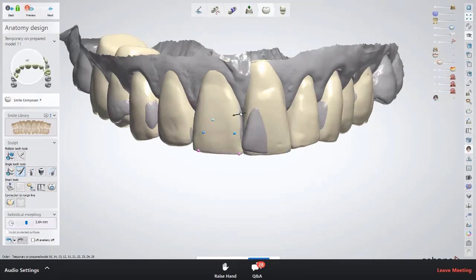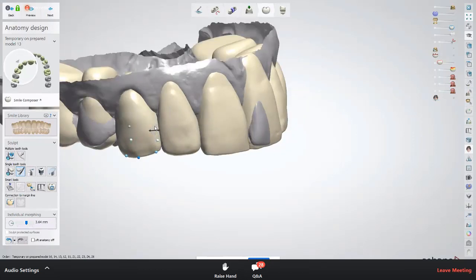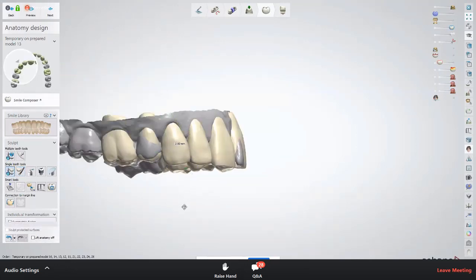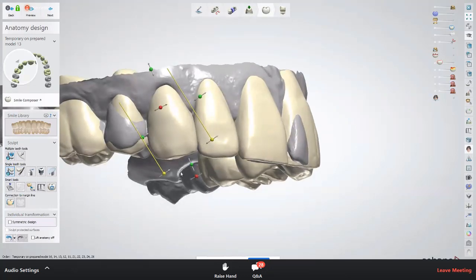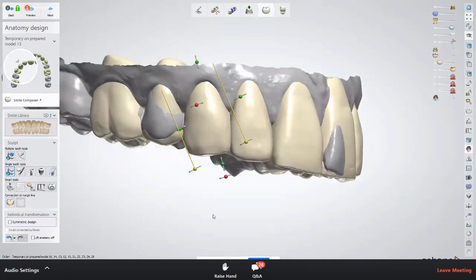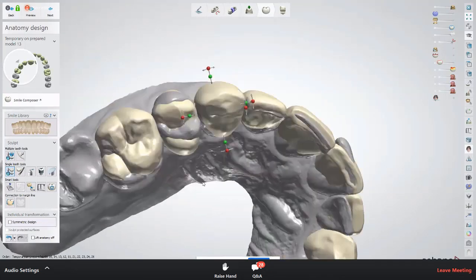So now I'm going to ask you a question, actually, if you don't mind. Absolutely. We have actually one question from one of the users that tried using the smile libraries, and it seems like they work quite well, except one place. If you go to individual transformation, especially on this canine, yeah, the first option, the global transformation. Yeah. Hold on. Is it this one or maybe yes? So it looks like the annotation points are slightly rotated. I believe that it was the library built like this? Is it something that maybe we can fix on our side?